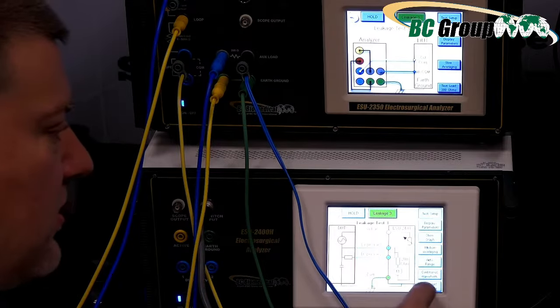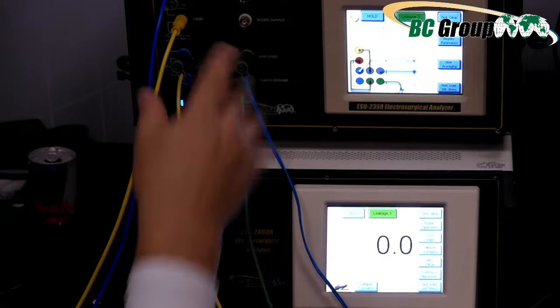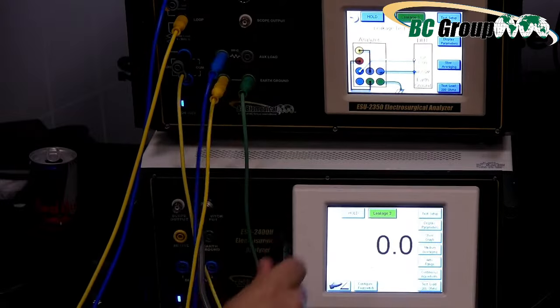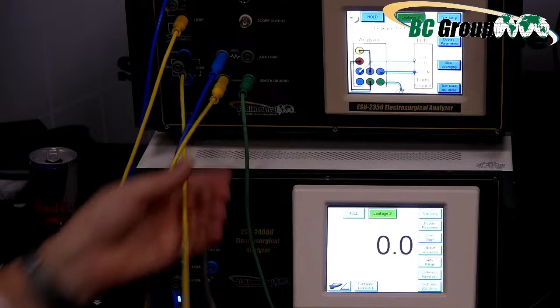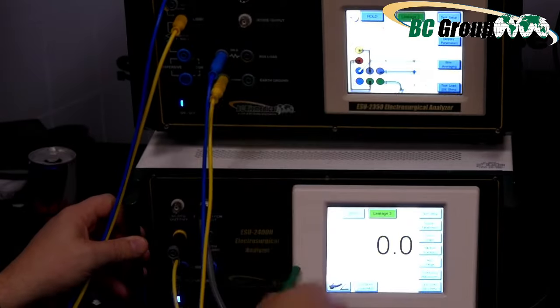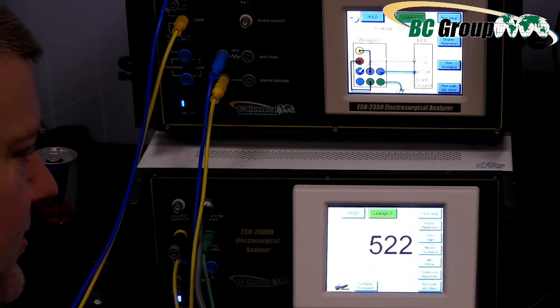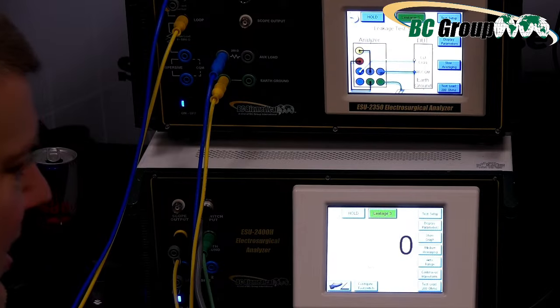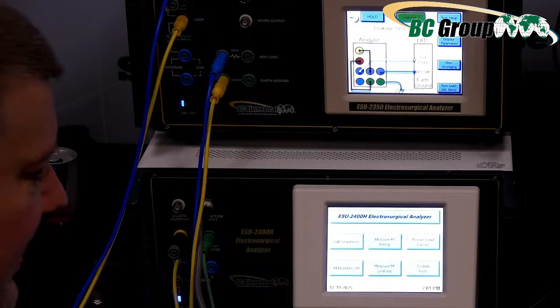And there we go. So we just go back and, again, activate the foot switch, which is not connected. It's up here. So let's see how fast I can set this guy back up. Again, blue to blue. Yellow, this guy right here, to yellow, and my earth ground to earth ground. Super fast, guys. Super fast. So there you have it. We just ran through the 4 different HF leakages, and I guarantee you a lot of people don't do it correctly.